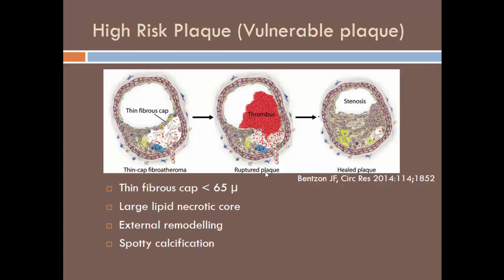Now, besides classifying the plaques as calcified, mixed, and non-calcified, there are certain high-risk features that should be described, which one can appreciate on CT angiography as well.